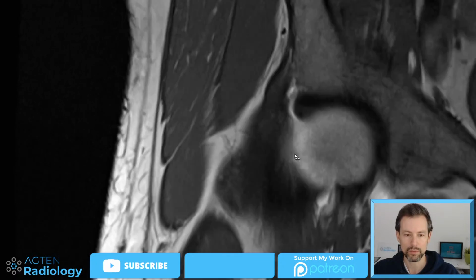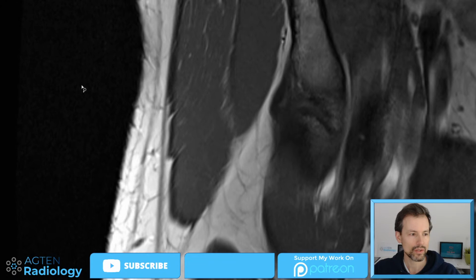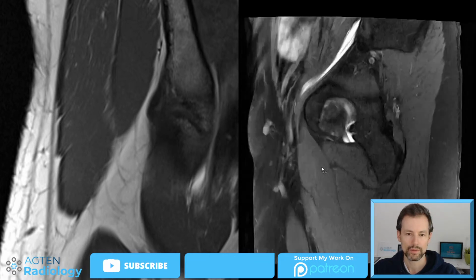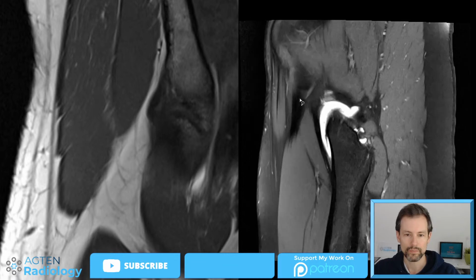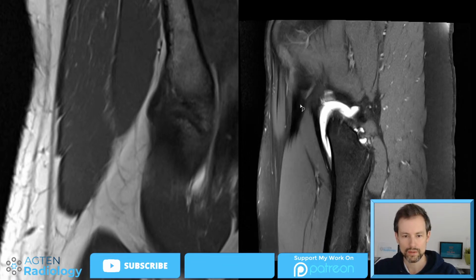So this is still the preoperative scan. So the rectus femoris tendon, it's not well visualized here. This is the most anterior section. Let me just pull up a second plane here quickly, this one here, so we can better see it. So this is the inferior iliac spine, and the rectus femoris is this one here.